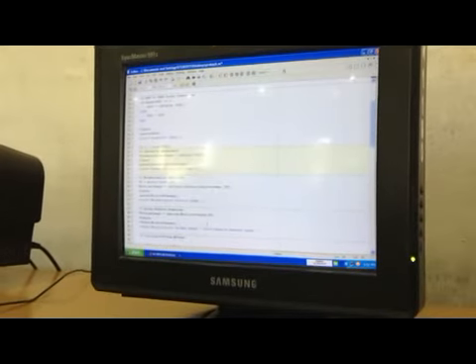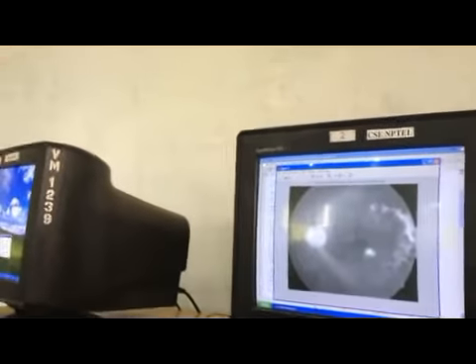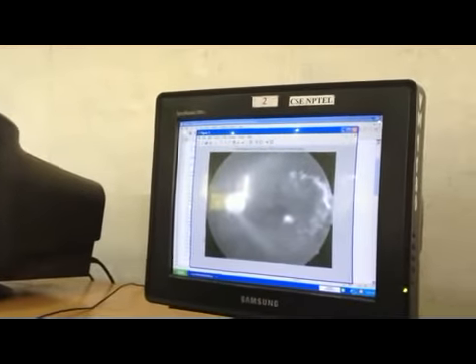The morphological image dilate is developed from the intensity adjusted image with the SE. As we already know, dilation is the addition of pixels into the image. And then we further process for the blood vessel removal. For removing the blood vessels, we proceed with the erosion of the image. Erosion of an image is nothing but deletion of pixels, which will lead to the complete removal of blood vessels in the image. And this is the blood vessel removed output image.